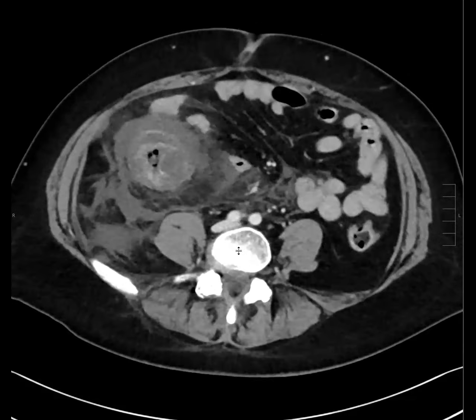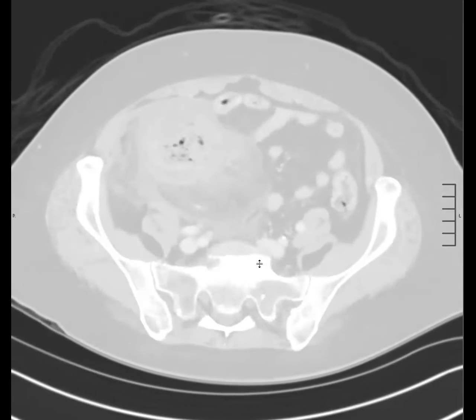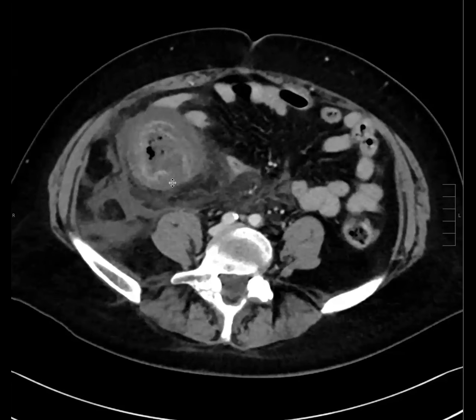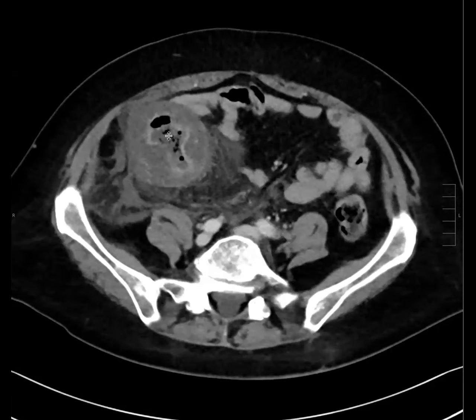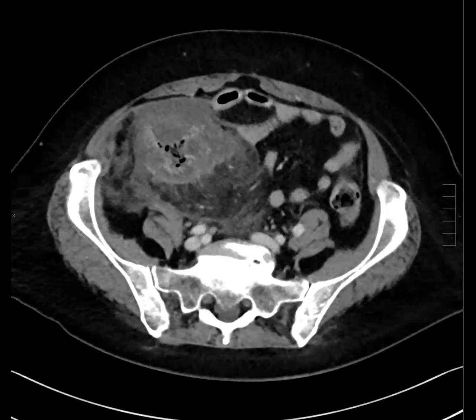Yeah, right. See if I can give you the lung windows. There's no free air, but you have one with the TI, the right colon, cecum, mucosa is falling apart. There's areas here, for example, that are non-enhancing, air bubbles kind of extending actually through the mucosa. Probably pneumatosis. So this was necrotizing enterocolitis in an adult patient.